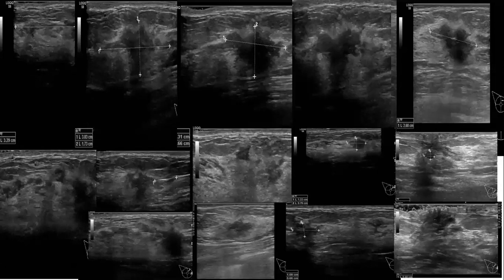Ultrasound demonstrates irregular lesions, confirming the suspicious findings with multidirectional ductal extension. So these are long spicules, not only thin spicules, some of which are ductal extensions, irregular ductal extension. Look at this mass here, and look at how this infiltrating duct is going that way.